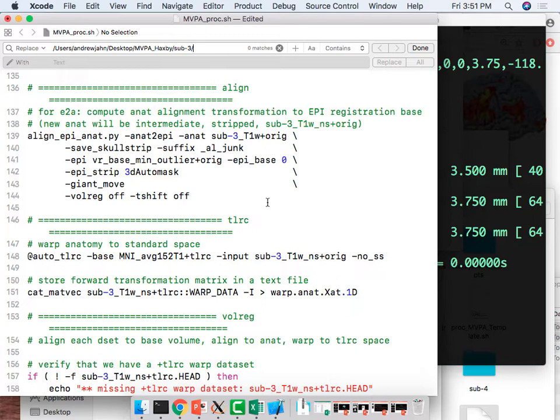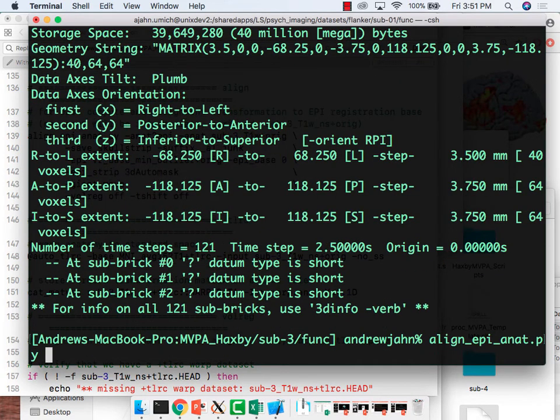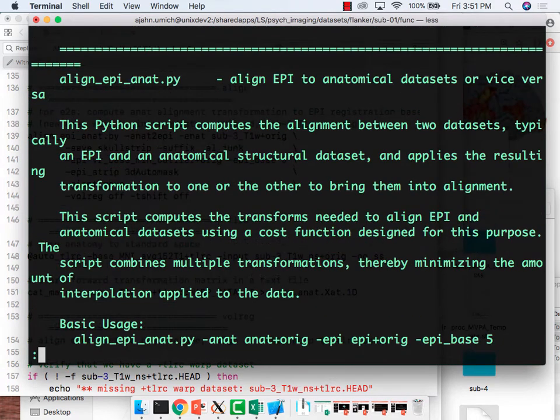So my plan was we would run through part of it. You would check it after this. You'd see that it was warped in a weird way. But I'm just going to tell you that that's what happens and program something so that you don't run into it. And the command for that is going to be init x.